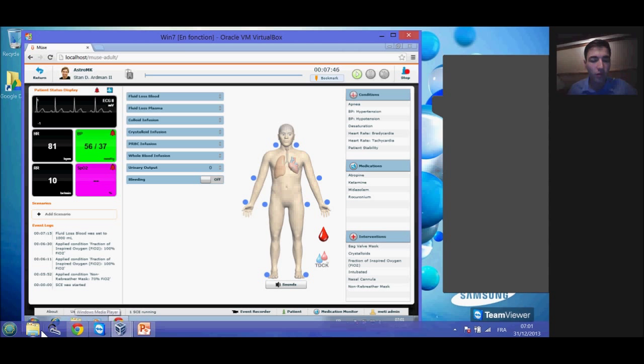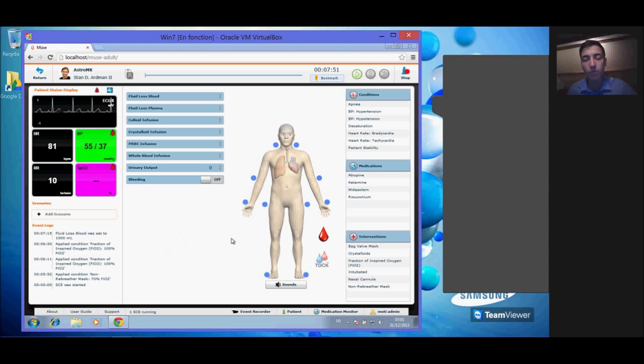If you go to the Word document with all the different steps, I advise to give some IV fluids, obviously, in this situation. So that's what we're going to do. If you go to crystalloids, this is when the simulation starts. The patient comes in, has a broken limb, lost blood, about a liter, and because of the settings of the specific model I input in the software, the hemodynamic tolerance is really bad.